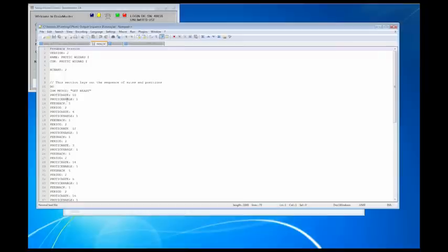So as you can see, it's a very, very simple process when it comes to photic. You got your photic rate, which says how quickly it's going to be flashing. You got photic enable. Now what photic enable means is, is it on or is it off? If photic enable is a 1, it's on. If photic enable is a 0, it's off.